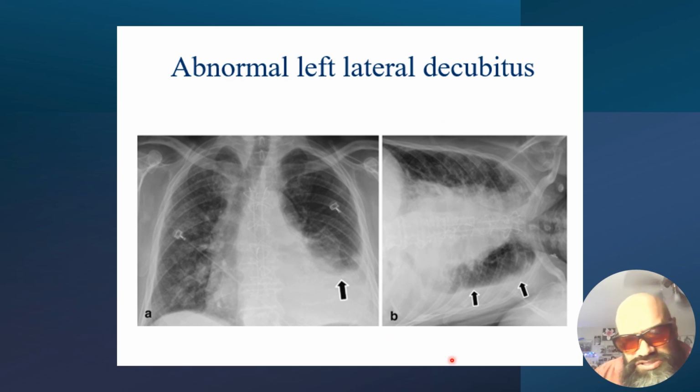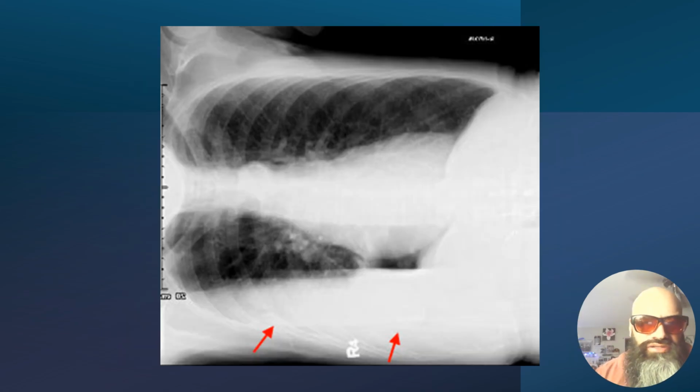When you lay on your side, it should even out and fill up the rest of the lung cavity, and you have this clear line of demarcation showing what we call an air fluid level. As you can see here, there's a little bit of air left here in the left upper lobe, and then the rest is fluid. So this is an example of an air fluid level seen primarily with the lateral decubitus view to help us identify between fluid versus purulent substance that is found within the lungs.